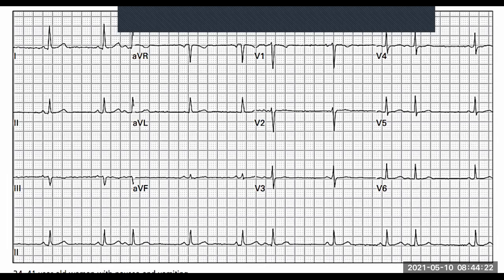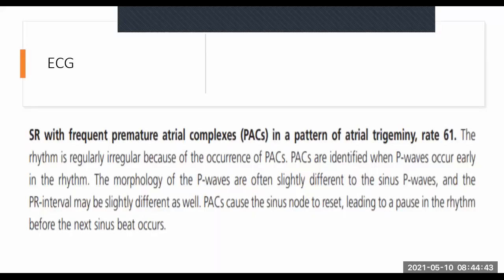It's kind of like how we sometimes look at an X-ray. We put it up against the board. The answer doesn't jump out at us. We put it down and write NAD. You know what I mean? Because we didn't see something. So sometimes what you've got to do is just spend those few extra minutes and just think it out a little bit and just rationalize it to yourself and think about it in terms of what you are actually seeing on the paper and what is physically happening. All right. So let's have a look and see.